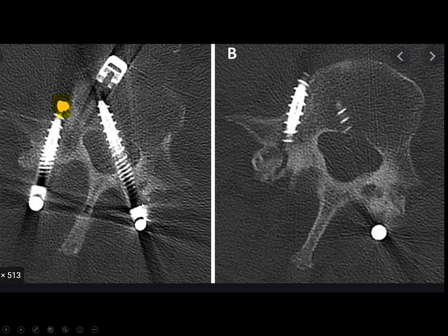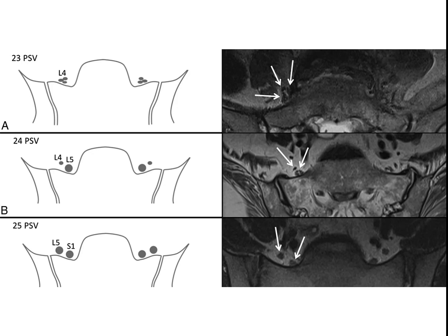And this case obviously has screws in the spinal canal, which hits the neurological element. It's a big problem. But then if you're lateral to the pedicle, you can hit the nerve root from above. This is the nerve root from above that's already exited, and it's coursing on the lateral aspect of the downwards pedicle. You understand that? So you can't be lateral either in the lumbar spine because you can hit that nerve root. And then the other problem you can have is in the sacral ala. You can hit the L5 nerve root if you're proud on the sacral ala because the nerve roots are there. You see them? So you never think about that, but these are the L5 nerve roots that have already exited the spine, and they're on their way down to the legs of the patient. And you can hit it if the screw's long.